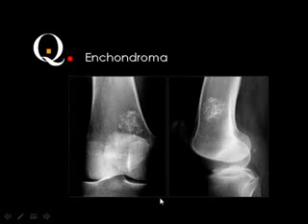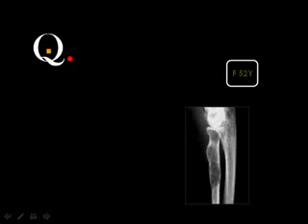Enchondroma, yes. A bone infarction is like the Chinese figures. Yes, you remember this. This morning we said the bone marrow infarctions are like the Chinese figures. This is a cluster of calcification which is classic for an enchondroma.